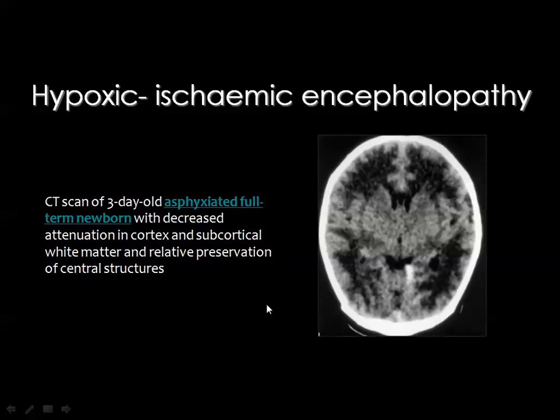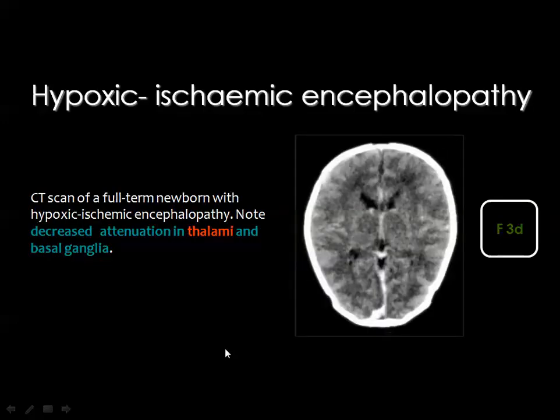And if you have the MRI, the water content of the white matter will appear low signal in the T1 and high signal in the T2. Then you need at that time the help of diffusion weighted images by MRI to separate the normal water content from the ischemic white matter.